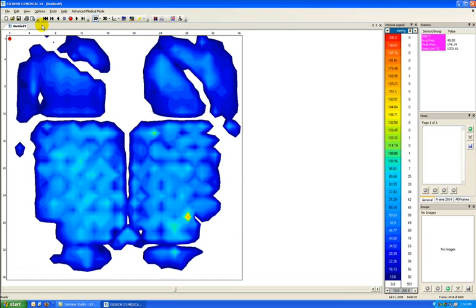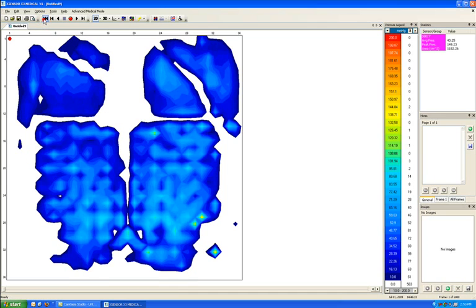Now that I've recorded some frames, I can actually go back and review them. The way to start at the beginning of the recording is to look for the rewind button. It's the furthest most left of the playback buttons in the top toolbar. If I click on this button, I'm brought back to the first frame of my recording. If I want to move backward or forward one frame in the recording at any point, I can use the step forward and then step backward button in the top toolbar.